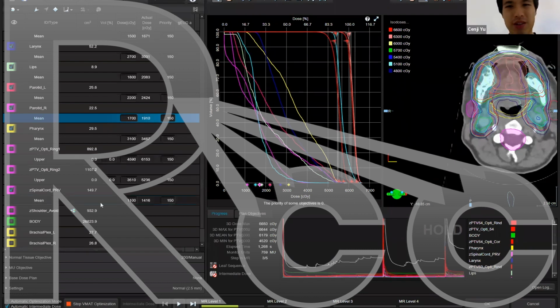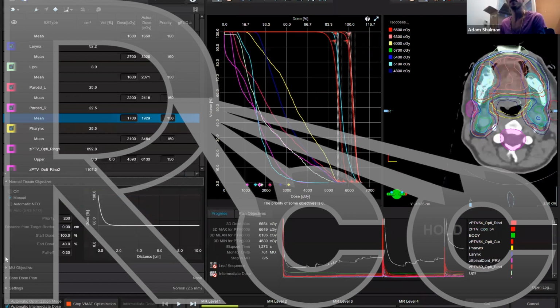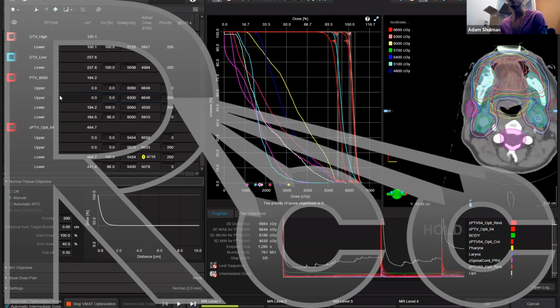Another question is, would you mind repeating the start dose and the end dose in NTO? Oh yeah, sure. It's on the treatment planning sheet that we've handed you, so make that your friend. But here they are: a priority of 200, 0 distance from the target, 100% to 40% at 0.3. So remember, this 100% is only working because we put that dummy lowest upper objective here at the same as our lower objective. And we've got a dummy because it's 0 weighting. So that's Eclipse users only.